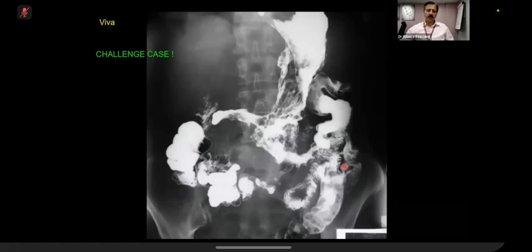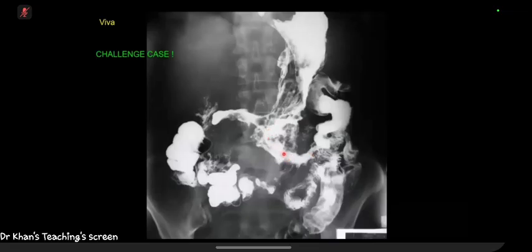Well done, but can I stop you because of time factor? I'll ask you a question. What part of bowel is this?